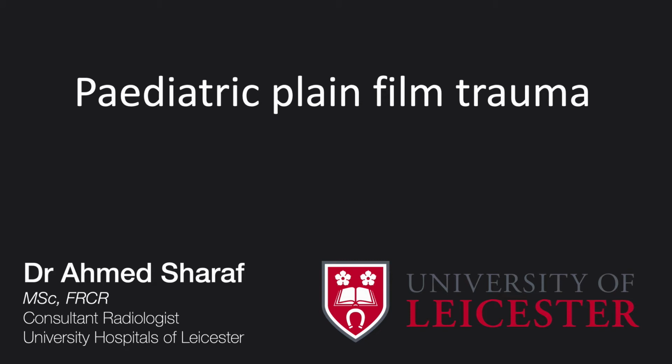Today I will talk about pediatric plain film trauma, but before starting to describe the various types of trauma or bone injury in pediatrics, I will give you some hints about the radiological anatomy of the bones in children.